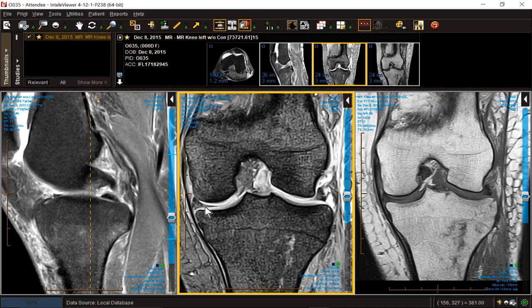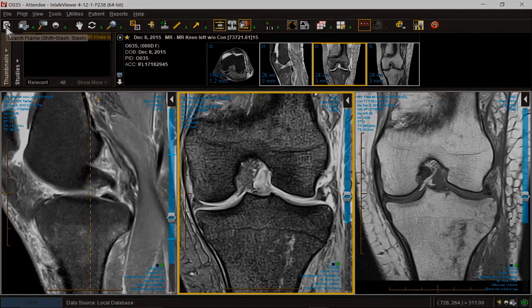Shall we do another? These are nuanced things that are critical to the management and care of people. I'd much rather you be under-callers than over-callers. Save the whales, save the porpoises, save the menisci.